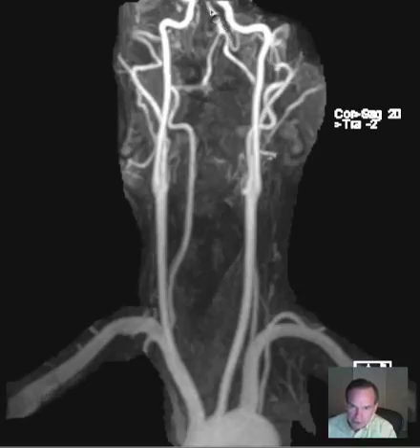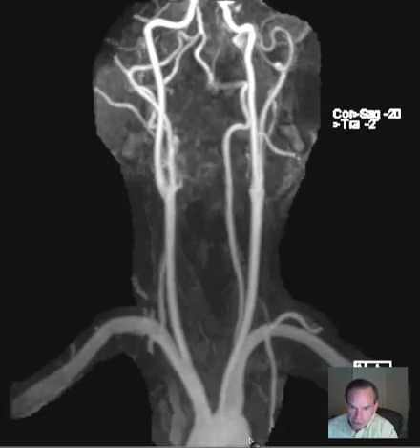So this structure here is immediately ventral to the brain stem, to give you an idea of where we are here. Okay, so here you have the aortic arch, you have the brachiocephalic artery. Now there's a brachiocephalic vein on both sides. There's a right brachiocephalic vein and a left brachiocephalic vein, but unlike that, in the arterial realm, we have only one brachiocephalic artery. So we don't have to call it the right brachiocephalic artery. In fact, that would be incorrect.